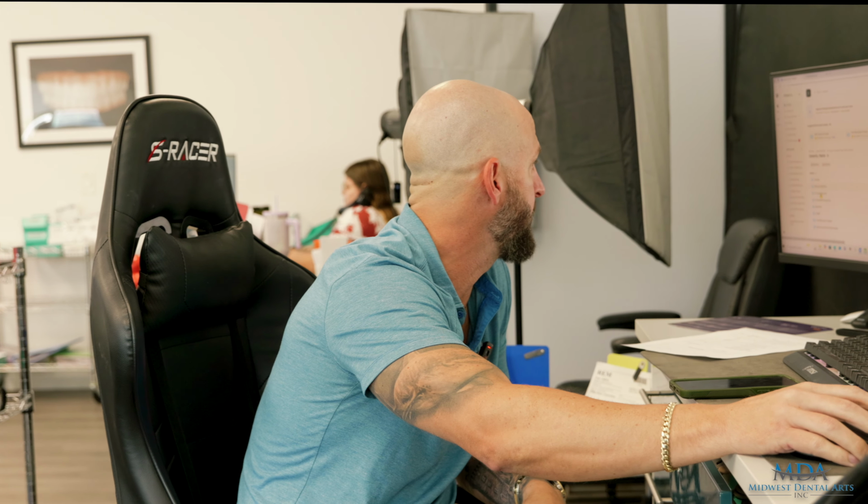All right, just got a case in. It's final healed scans. So let me look on my computer and see when we did the on-demand CAD. So about 3 months ago, we did an upper and lower surgery with a dentist in Connecticut.